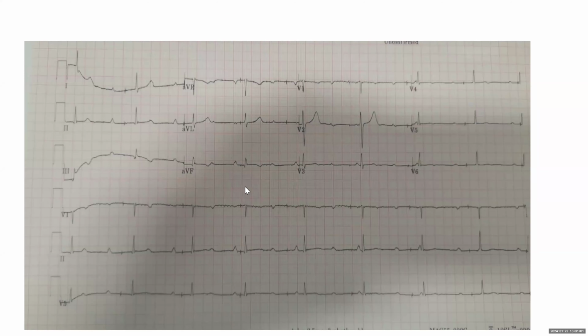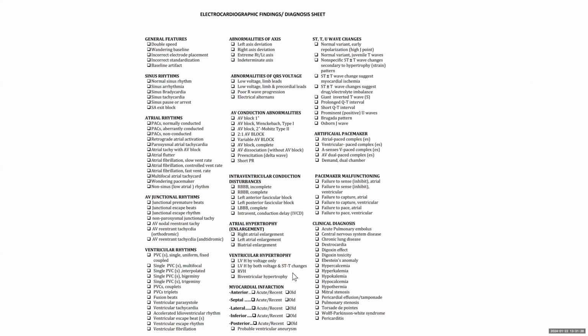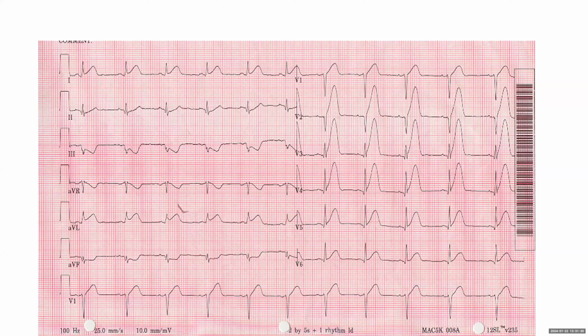Type of pacemaker here: this is a single-lead pacemaker. This is all you can tell from the ECG, not being given history or chest X-ray. You know that there is one lead. It's probably in the V, because that's how we do it. But you can't really tell anything else. Okay. So this ECG, back to this ECG.